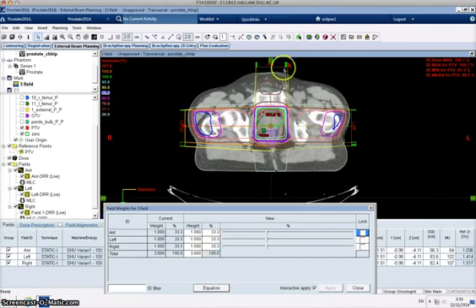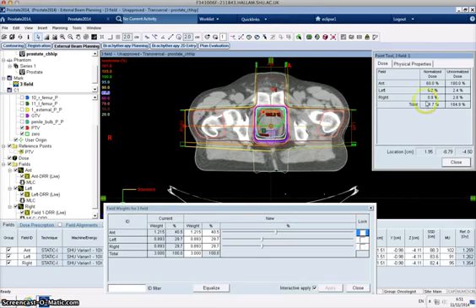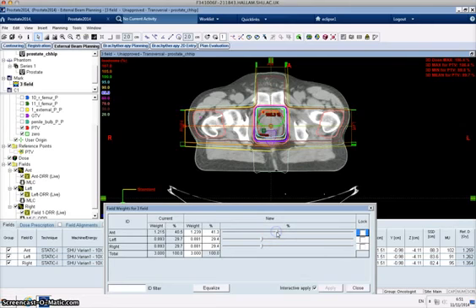So what I'm going to do is put more dose through the ant and less through the lateral. So again, it's an iterative process. I don't know the answer to this, so I'm just going to start gradually changing that. Let's go back to where it was. We can see that the pink colour, that 80%, has now gone from the left side. There's still some there on the right, so let's give that a tweak more, and a tweak more, and we can see we're now increasing the dose up here. If we bob our little slider there, it's gone from 52% to nearly 62 now. So I'm just going to keep increasing that to something like that maybe.